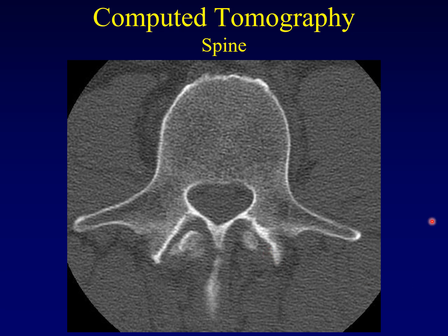What's really annoying, though, is that you just can't make out any of the soft tissues here in the spinal canal. You can't distinguish the CSF that we know is surrounding the spinal cord itself. Even if I narrowed the windows, that might help. These two are too close together and there's too much artifact from the surrounding bone. It's just always going to be really hard to tell those apart. Remember that when we come back and talk about myelograms.